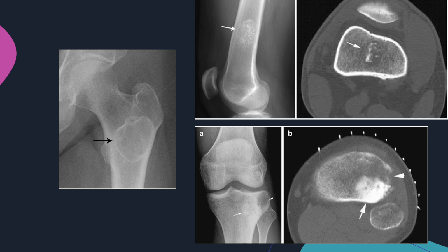Look at the proximal femur. We have a geographic sclerotic lesion. On the distal femur, we have stippled calcifications, intramedullary, which represents a possible cartilage lesion. While on your proximal tibia, we have a mixed lesion of blastic and lytic.